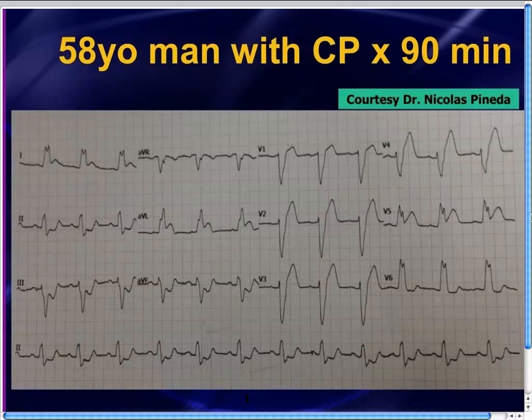Well, when somebody's got chest pain, we've all learned that you can't read any ischemia in the presence of a left bundle. Well, if you've been keeping up with the literature, unlike perhaps some of your consultants, no names to be mentioned, you know that you can actually, in many cases, read ischemia in the presence of a left bundle. Not always, but in some cases you can. So that's what we're going to spend time talking about.